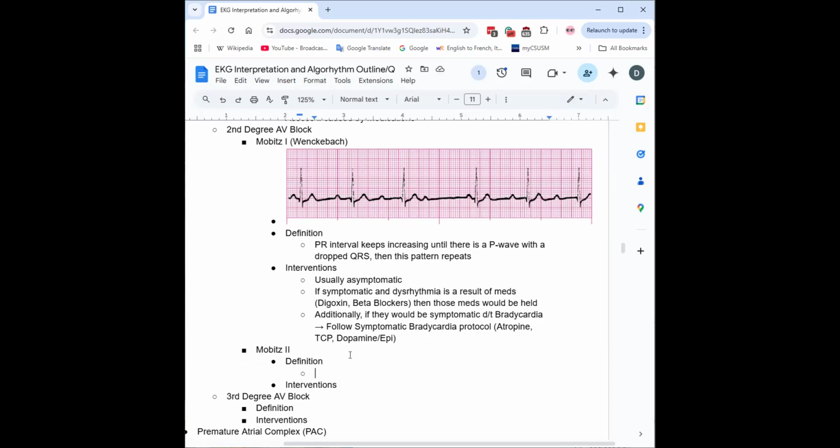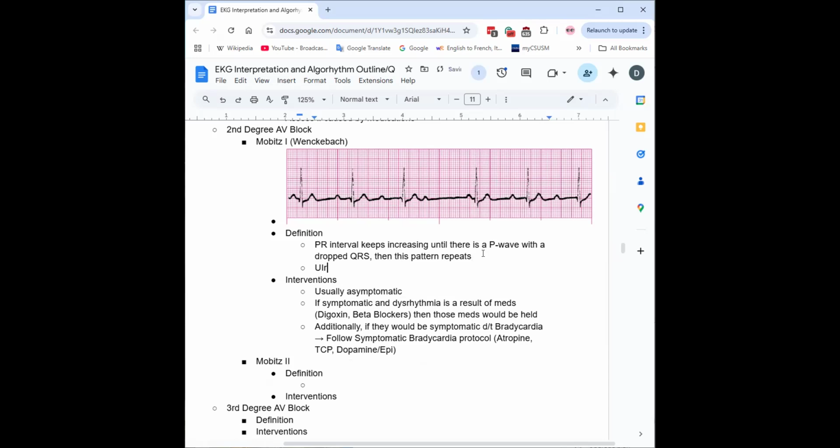Yeah, irregular ventricular rate. I'll add this to this one too. Is it really as often as every other? It probably can be. So type 2 is more serious than type 1, definitely, because of how often it happens. I just don't think I considered how often it could happen. So, potentially every other beat.